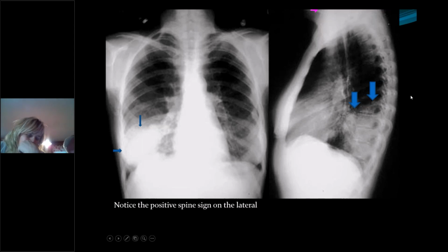When we look at this lateral view, you start out kind of light, a little bit white, then it gets a little bit darker. It should stay darker as we go down. However, as we go from light to dark, and then all of a sudden it gets light again, that light area is density. We shouldn't be more dense there. It should be the same color as what we see up here. And so as we go down, we see this increased density.